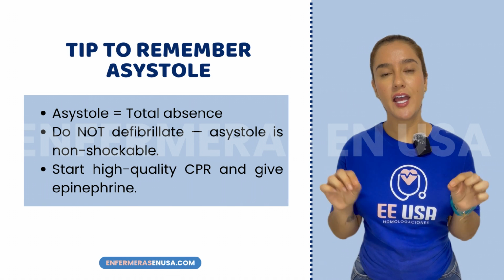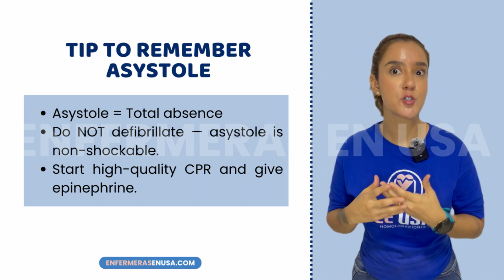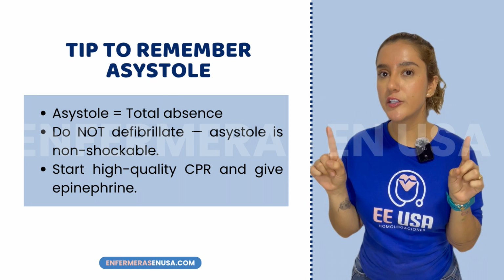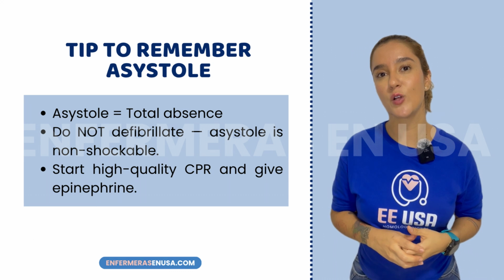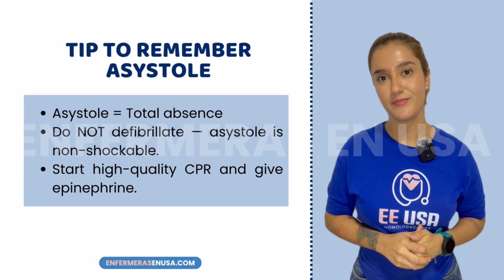If you see a flat line, first check that the cable is connected and the equipment is working before declaring it true asystole. Once confirmed, act immediately. Do not defibrillate. Begin high-quality CPR, give epinephrine, and search for reversible causes, the 5 H's and the 5 T's.